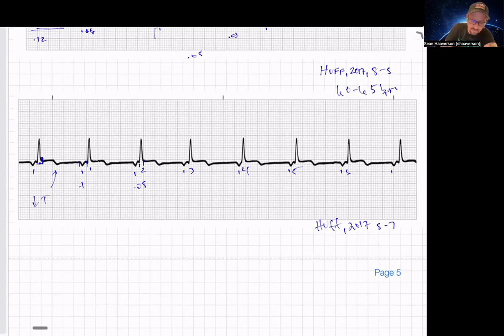Again, this is lead 2. So we're probably going to need to clean this up diagnostically using a 12 lead. But from what I can see so far, we may be concerning ourselves about some injury or ischemia, maybe even infarct if we've got an inverted T wave. But again, we need a 12 lead to check that out. So something that we are concerned about: maybe a little bit of elevation, inverted T wave.